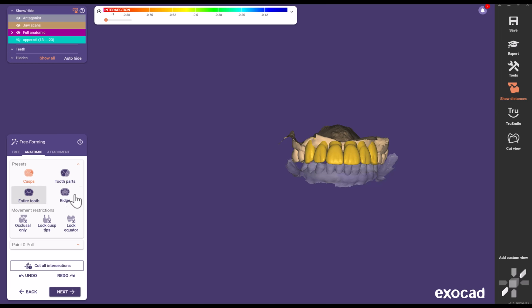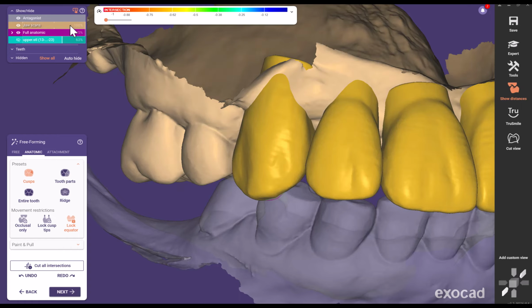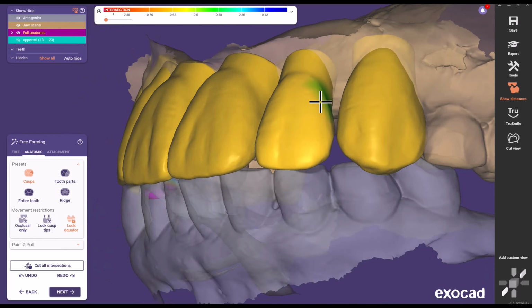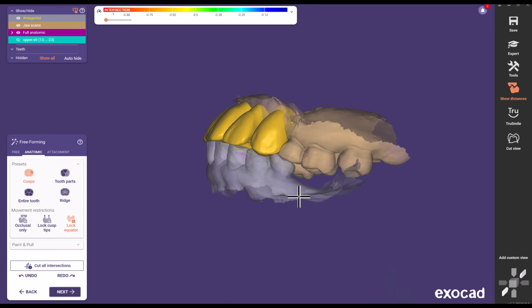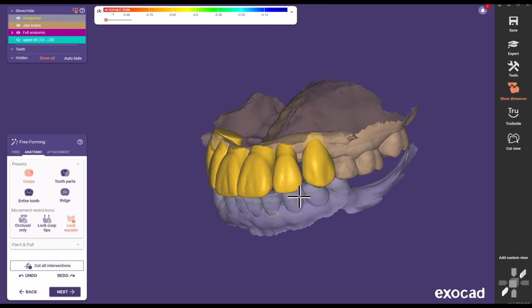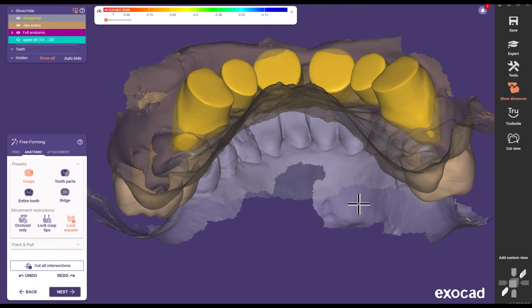And now we can start doing our more localized tooth movements. So what I'm going to do for starters is lock the equator, and I'm going to grab the necks of these teeth. Clearly these have got to be long teeth, right? I haven't really made the determination yet of are we going to require pink on this or not. I'm going to at least try initially to do this without adding pink. So that being the case, I need to stretch these teeth up and make them longer.